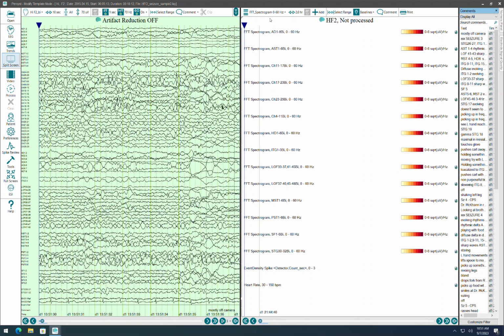Now we can also do, because these are going 0 to 60 hertz, we can also do versus baseline trends, where it'll calculate normalized z-scores from a baseline. And what that allows us to do is to see changes across the whole spectrum, 0 to 60 hertz, because it normalizes all the values within that empirical null that's calculated by the baseline. And well, we can get more into that another time with another example. I've also got another screencast on that. Let's just go ahead and create the trend.